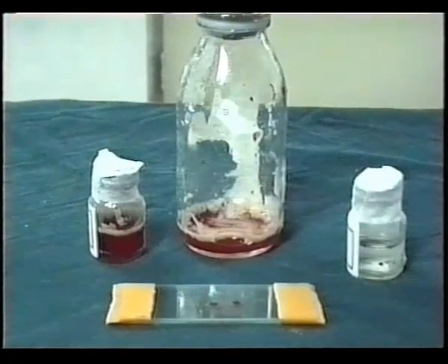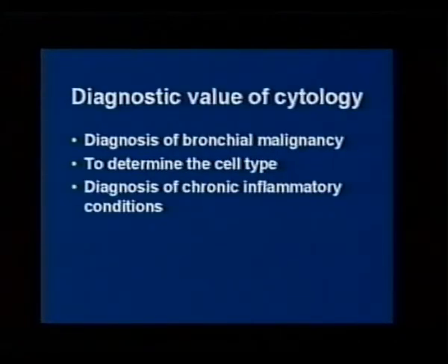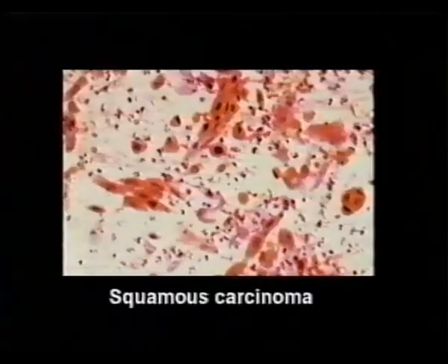The samples are then sent to the laboratory with detailed request forms. Cytology is useful to diagnose bronchial malignancy, to determine the cell type, and also in certain chronic inflammatory conditions. Let's look at some of the slides now.